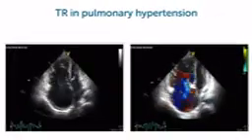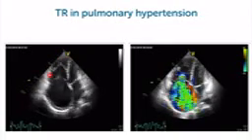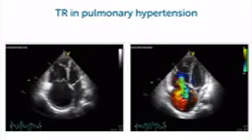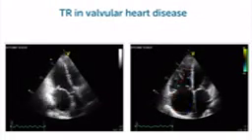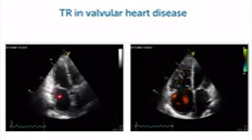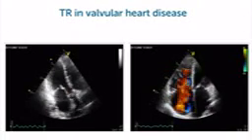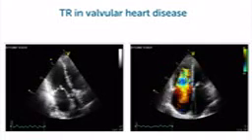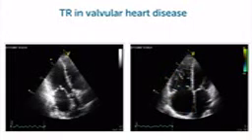And here are some examples where you could find tricuspid regurgitation. Patients with pulmonary hypertension. You can see that pulmonary hypertension led to a dilatation and dysfunction of the right ventricle, which causes this massive TR here. This is a patient who has a left heart problem this time, actually mitral stenosis, as you now well can appreciate. There's doming of the anterior leaflet, and this causes what we call post-capillary pulmonary hypertension, which again dilates the right ventricle and leads to tricuspid regurgitation.